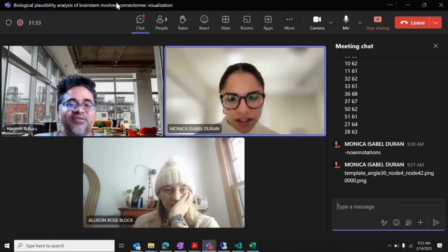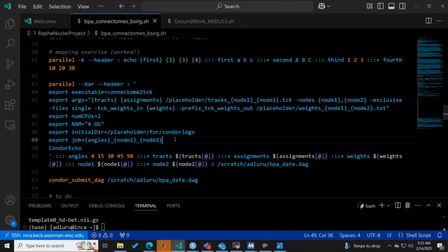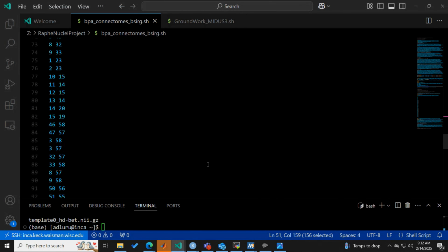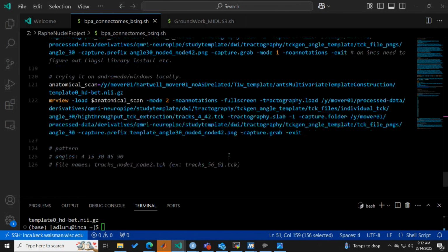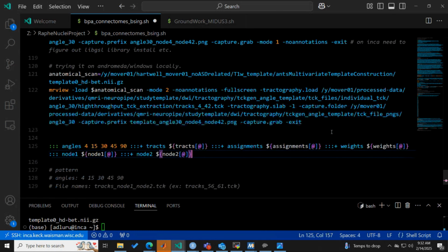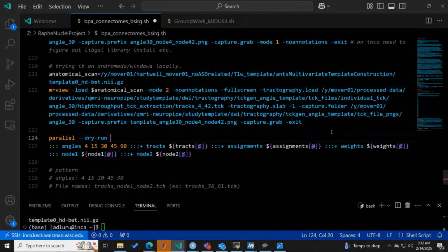Sorry, actually, go back to that piece, the Condor echo. How about this? I create a pseudo, and then you can fix that. I'll create like a quick thing. Would mrview go in the executable? No, I'll show you. That's why I said there is no Condor anymore. That's true. There's no Condor anymore, but I'll show you. Don't worry about it.